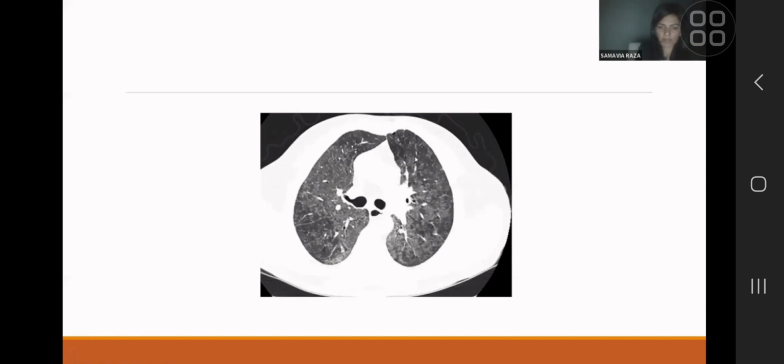But what is important about this ground glass? It is nodular. There is a texture to it. It's like if you touched it, you could have a texture in your hand. And that means that it is nodular looking ground glass. And when there is texture to ground glass, that nodule is almost always in the centrilobular distribution.